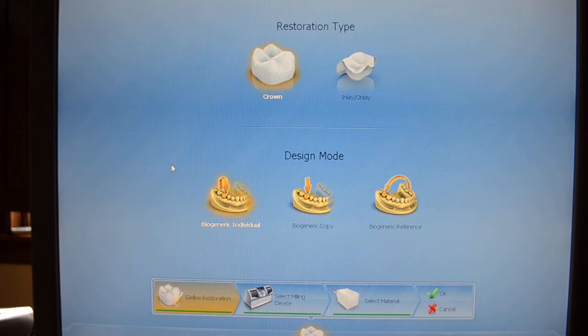is what cerec is going to do is, in this instance, because we're building number 30, it's going to look at tooth number 31. It's going to say, where are the cusps? How does the buccal lingual contour look? What are the mesial distal dimensions? Is the anatomy very extensive? Is it very shallow? And it's going to use tooth number 31 to design tooth number 30 for us. So the software is pretty much building our entire tooth, at least initially.